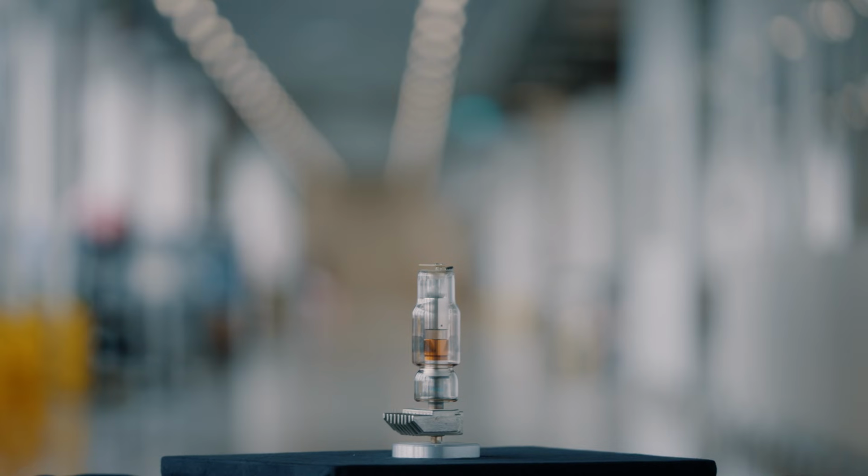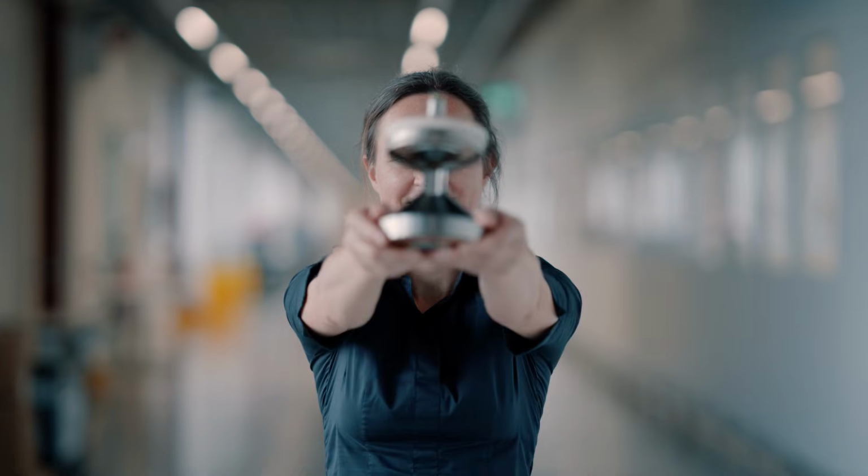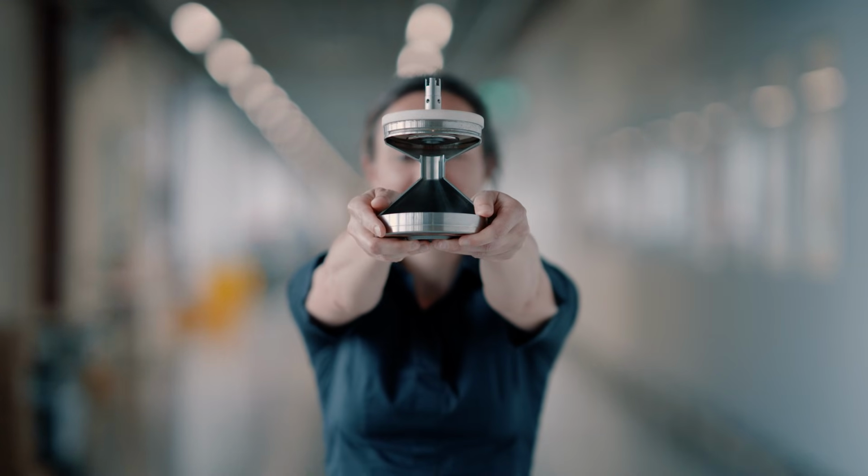In all these devices, the X-ray tube is the primary source for generating the X-ray radiation that is essential for image creation. X-ray tubes differ significantly in their construction and appearance, depending on the medical device they are used in and their specific application. These differences arise, for example, in the focus spot size, and thus the image resolution, the tube voltage, the physical design itself, as well as in the anode construction and anode material.